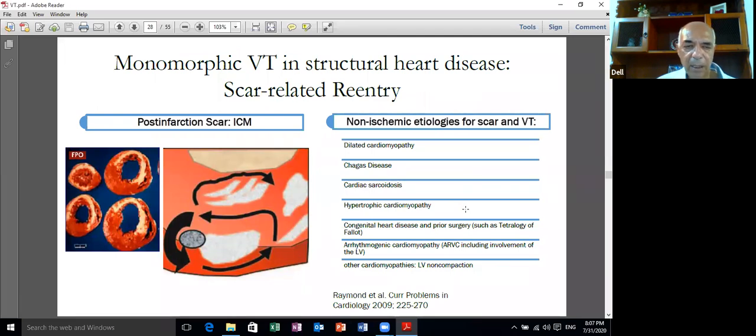You will get here the scar tissue, which is present in the white color here, and intermingled here and pierced with the scar tissue is viable myocardium. The word viable here means that it is conducting electricity but is not participating in contraction. And that gives the excuse for the electrophysiologist to ablate everything here, not sacrificing the contractile power of the myocardium.